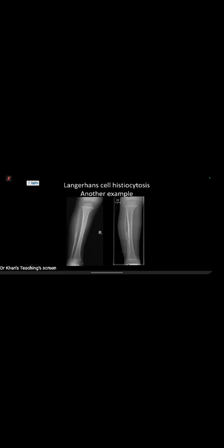Most commonly, in exams, you tend to be shown a child with a spinal film or imaging with a vertebra plana. So again, this is another example of how aggressive and how different it can look in different bones. This is thought to be an aggressive lesion, quite rightly so. You can see it's very ill-defined. It's causing remodeling of that bone. The child went on to have an MR. I'm not sure the MR really helped to narrow down that differential.